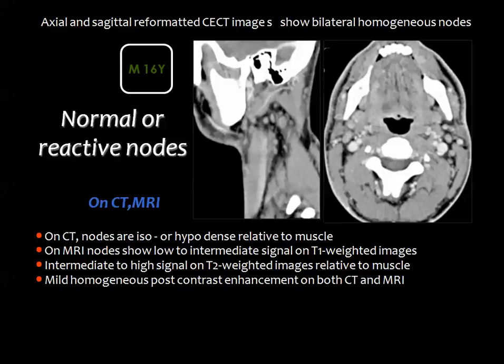are homogeneously enhanced. And it is considered one of the mistakes that you consider these nodes belong to metastatic disease, for example, in a patient having primary malignancy even in the neck. Then we should be careful about nodes in the neck before saying that these are metastatic or not. You consider the size, and you consider the enhancement, and if there is an overlap, then we should go by the usual and regular way for confirming the diagnosis, which is to obtain a biopsy by ultrasound.